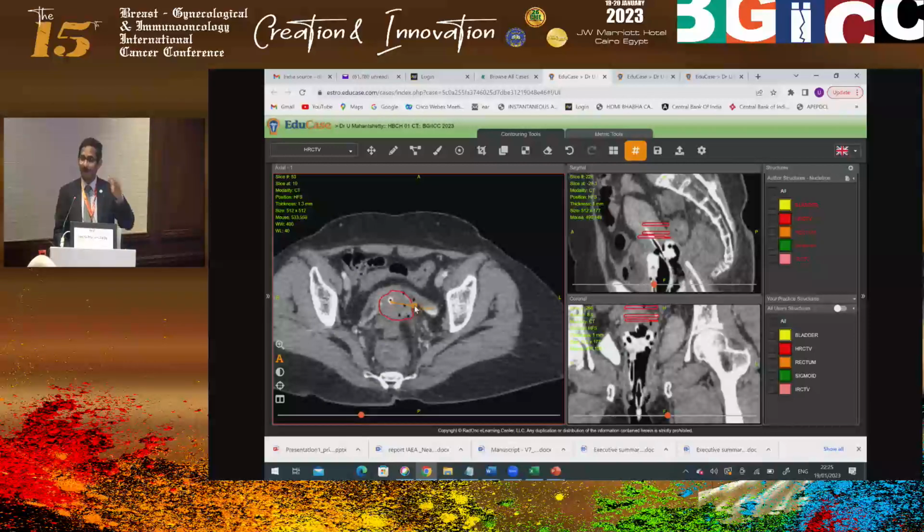So like that, if you are able to do it in your clinical practice with clinical drawing at diagnosis, clinical drawing at brachy, and then MR image at diagnosis or CT image at diagnosis. So if this patient didn't have an MRI at diagnosis, what would I do? I would easily directly measure this length, that's 6.5, right?